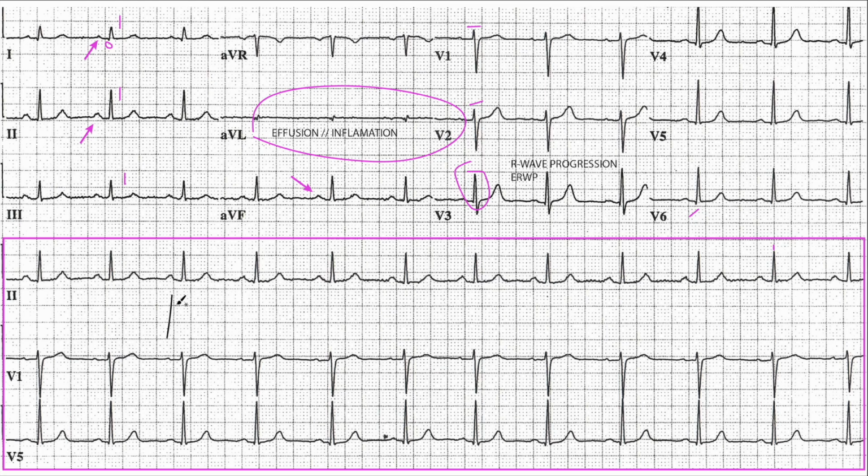So what do we have when we sum it all up? We have normal sinus rhythm running at 70 beats per minute. And what do we have? We have first degree AV block, borderline. We don't really have it, but if this patient is young, that is significant. And by young, I mean under 50. It's very specific for first degree block. When I mention the age under 50, I'm not being biased in any way, shape, or form for anybody that's over 50. And then what else do we have here?